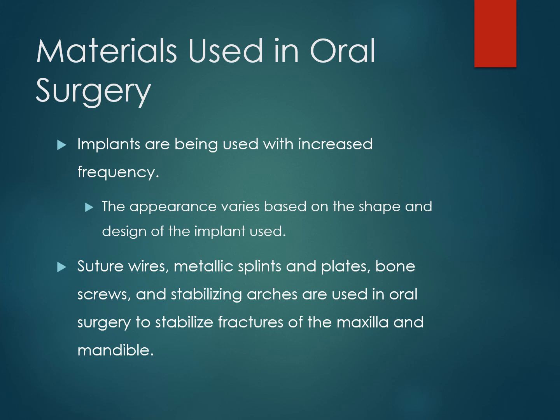Implants are being used with increased frequency. That's absolutely true. A lot of our patients have implants. The appearance varies based on the shape and the design of the implant used. Now, your patients think that all of the implants are the same, and that is not true. There are many different types of implants. There are many different brands, and each brand has their own shape and their design. They have different sizes. They have different retention techniques.